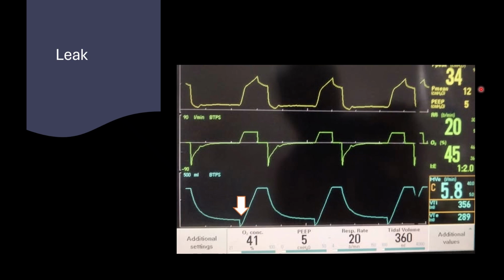In our hospital, the cuff leak test is usually done by the respiratory therapist. What they do is deflate the cuff and assess both inspiratory and expiratory volume. This is numerical, or you can look at the percentage leak, and also you can look at the volume scalar. Tolerable leak should be less than 10% of tidal volume. That's what they say. And in case of cuff leak they also say it should be more than 10%. Then only you can go and extubate the patient, otherwise try not to extubate.